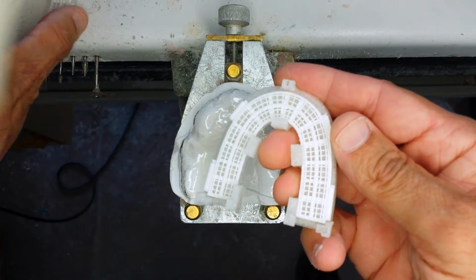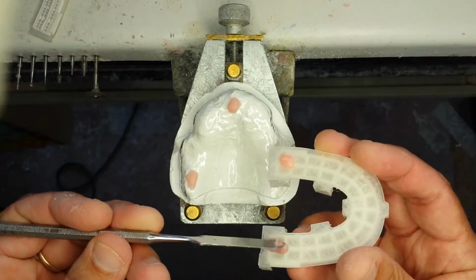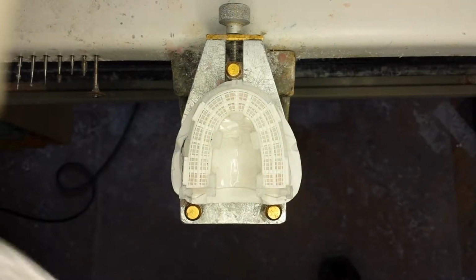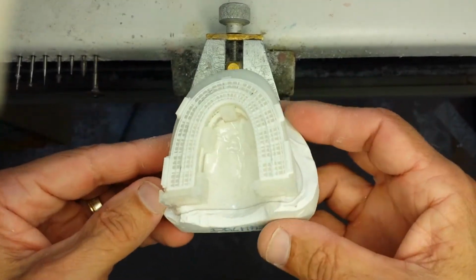The grill in the left hand is occlusal and in the right hand gingival. This is the one that is fixed to the mold. The occlusal grill is then clipped onto the gingival grill. The radiological guide is now ready.